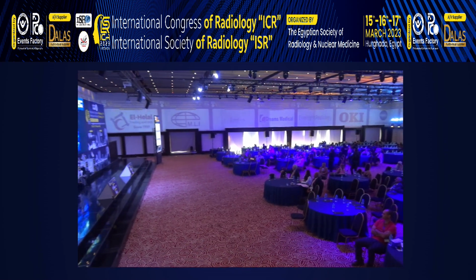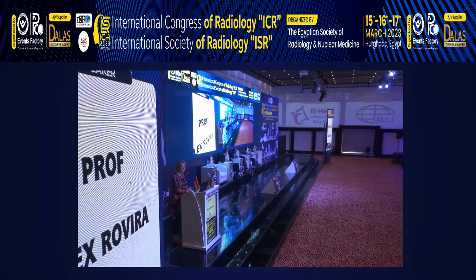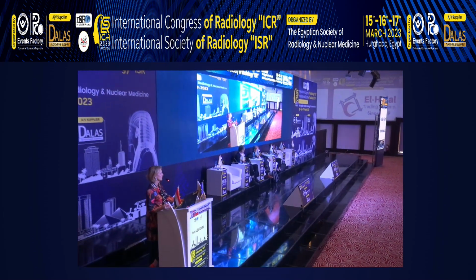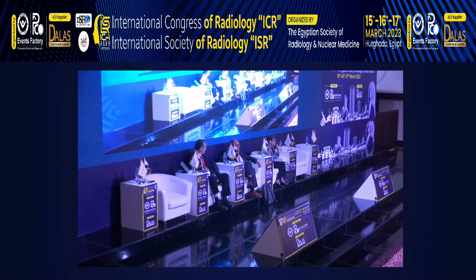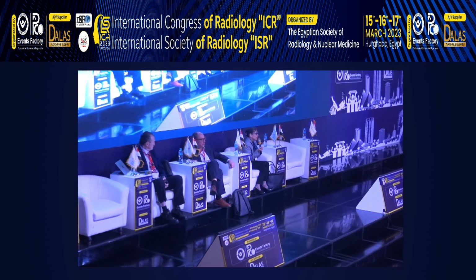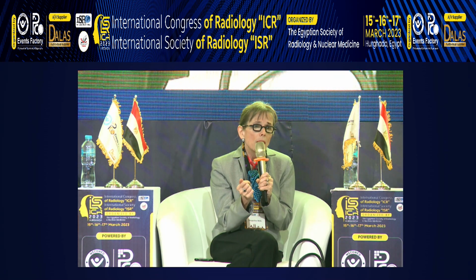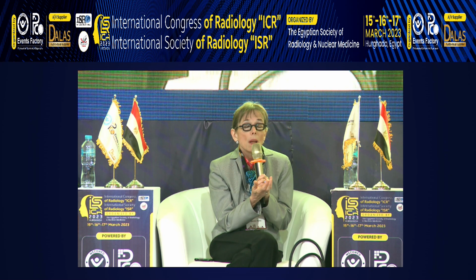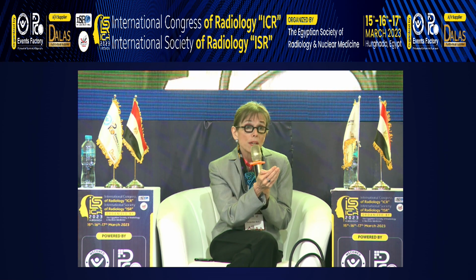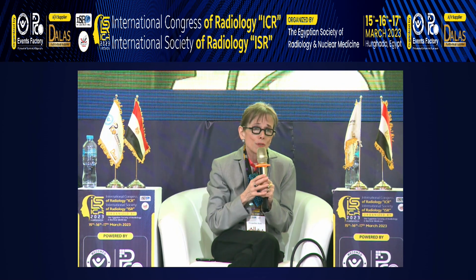I don't know what sort of a non-neoplastic lesion that might have been. Certainly not demyelinating, infection because of the diffusion. It was too much white matter for infarct. So I think that really we were left with neoplastic, but quickly went to low grade most likely. Can't rely on the enhancement as those 2 cases and many others have shown.